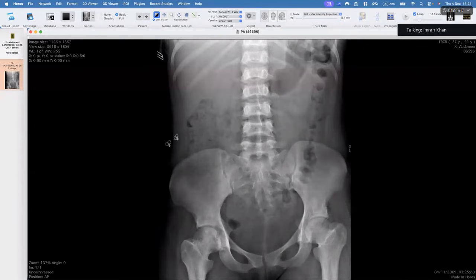I would let the clinical team know that at this point in time, I can't see any sort of collapse of the femoral head, right? And so in this kind of case, you've picked up the most important findings, right? You've picked up that there's H-shaped vertebrae, there's avascular necrosis. You've added 1 and 1 plus 2 together to give the diagnosis of sickle cell disease. You can give the relevant negatives in this case.